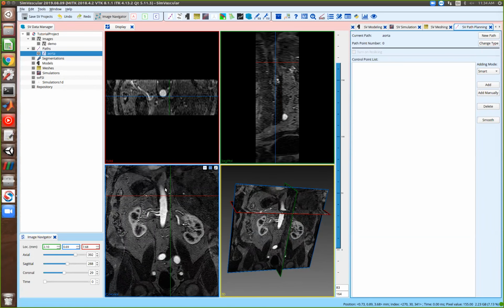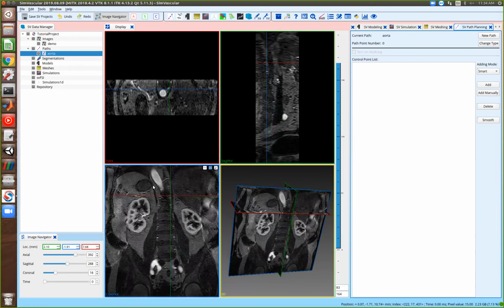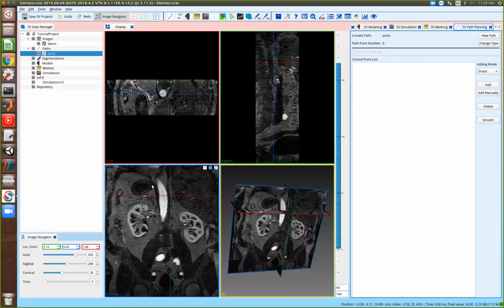And just to give a recap of the geometry that we might have seen from the volume rendering, the aorta is this very long, large vessel that goes from your heart and arches up and then goes down through the descending aorta towards your legs. But we want to start at the portion that's closest to your heart. So what we're really looking for in this image data as we scroll through is that arch that goes down.